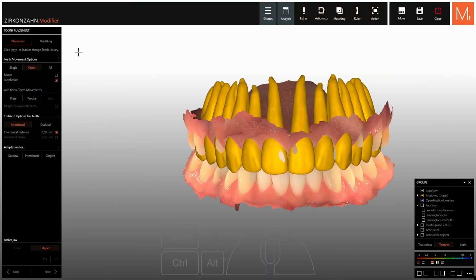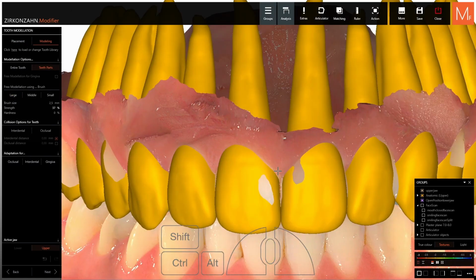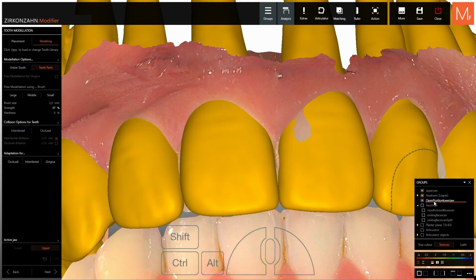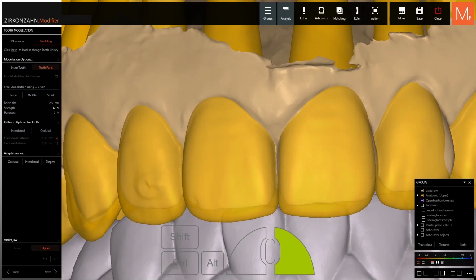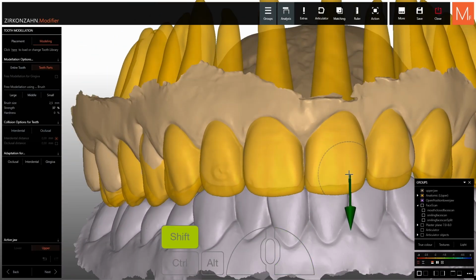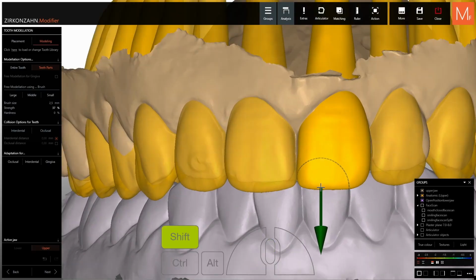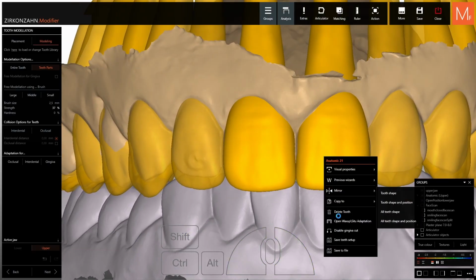We transition over to modeling and deactivate interdental collision. Once again, I will be mostly using teeth parts for my modifications, and I also strip the texture first to spot the marginal edges clearly. If you want to change the tooth shape a bit, we tweak one side, right-click to mirror, and have your workload just like that.